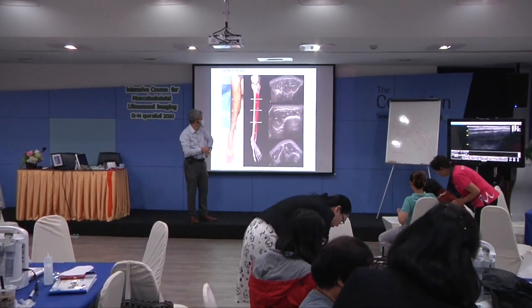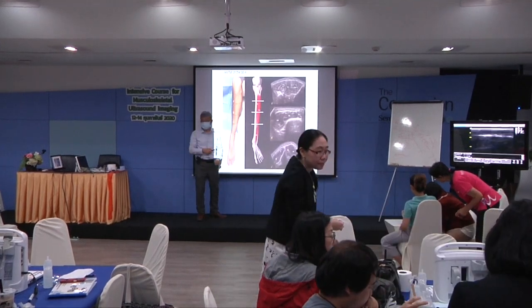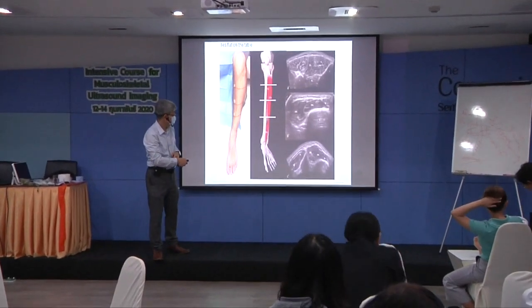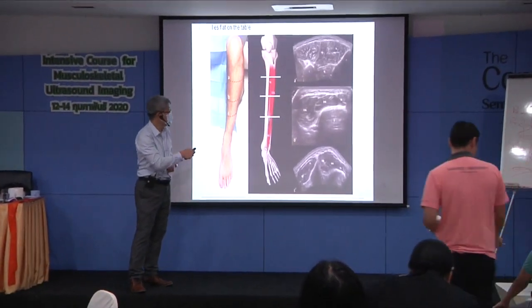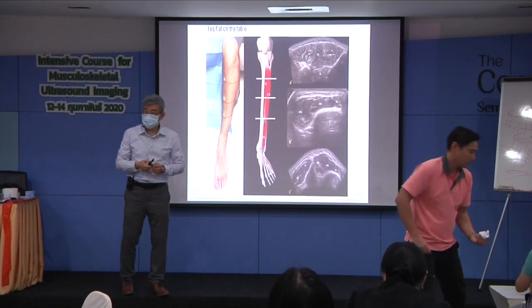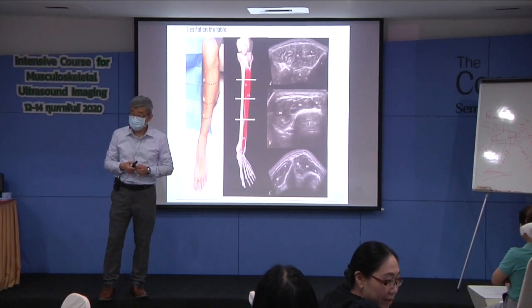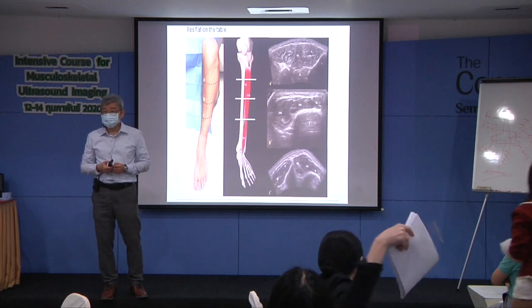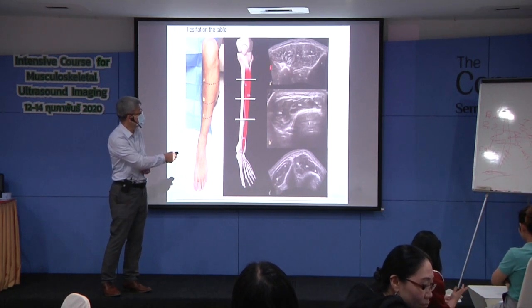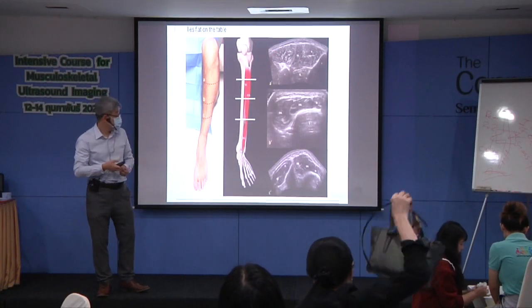Morphology in the anterior leg is very, very important because if your patient has any injury history that you think is related to muscle tear, muscle contusion, compartment syndrome, or delayed onset muscle soreness, they are all related to muscle morphology and hypoechoic appearance. Okay?